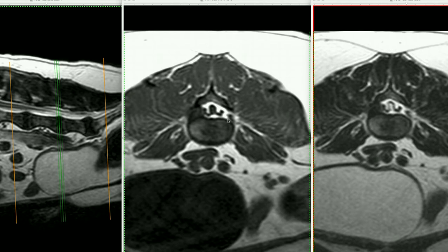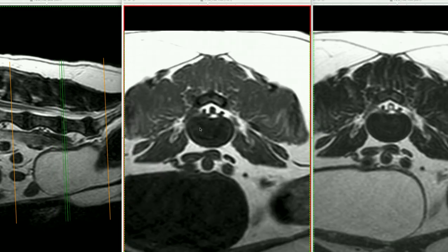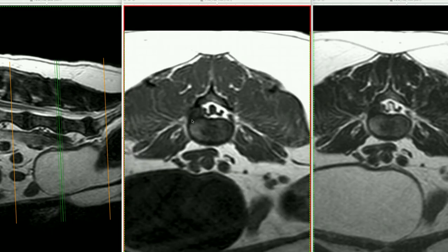We see very nicely on the T1 weighted image here the normal appearance to the intervertebral foramina, where we have in this case the L6 nerve with the normal periradicular fat. And on the contralateral side, we can see that we have this nodule of low signal, relatively homogeneous, smoothly marginated tissue, which is filling or largely filling the intervertebral foramina.